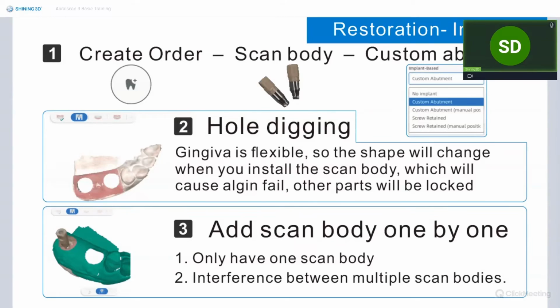What I did is the same as you guys, it's a normal scan. Aoralscan may not pick up models as fast as yours, I think it's more related to your PC configuration. Our scanners came without sound, so I will check with your scanner later. I think this sound should be turned on automatically.